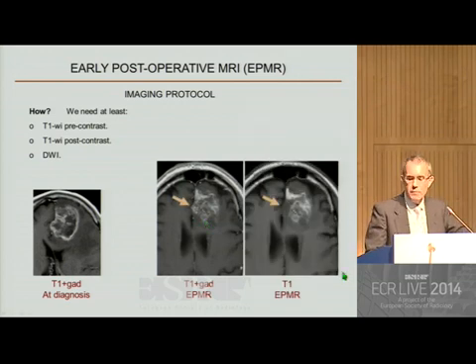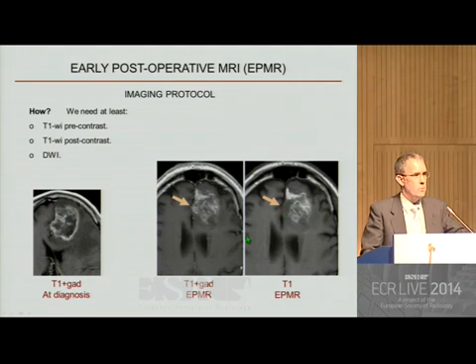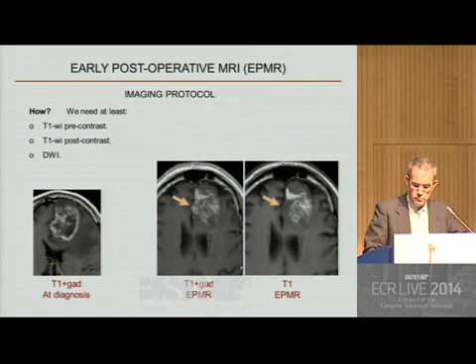And if we have this T1 pre-contrast, we can see that here is a hyperintense area in T1 pre-contrast that corresponds to hemostatic material. Not all this lesion is residual tumor. Just this small medial piece corresponds to tumor. This is a partial resection. We need to compare pre-contrast to post-contrast to be sure that what we are evaluating are contrast enhancements.